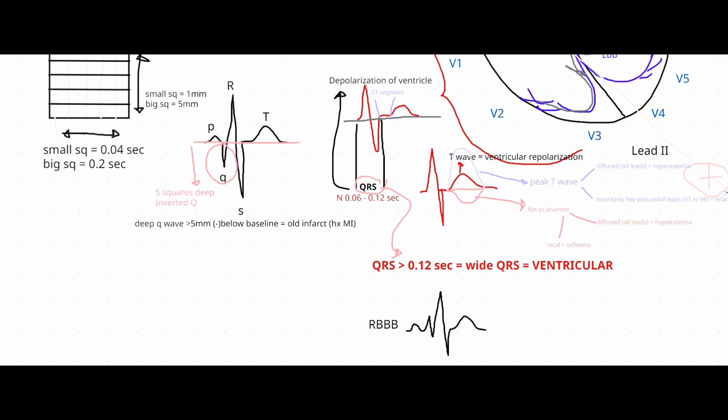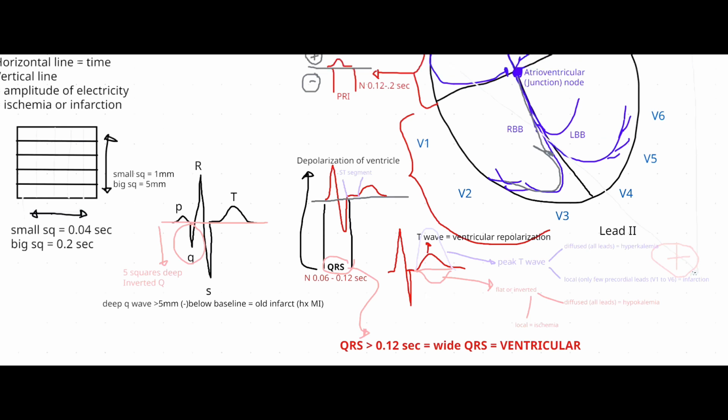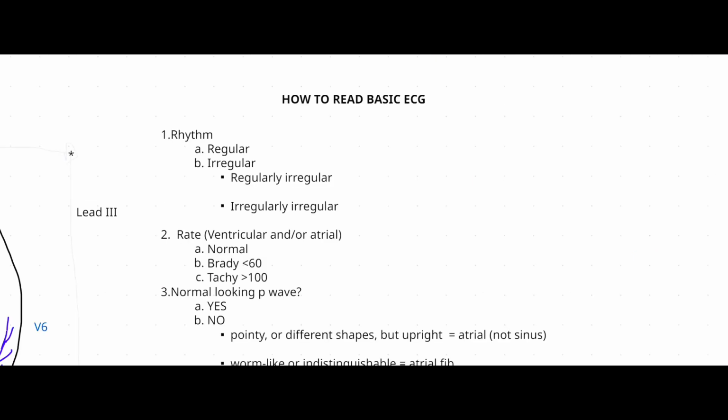When the QRS is prolonged, again, apart from the PVC, then again, it could be an electrolyte issue, hypoxia, hormones, such as in females, the estrogen depleting can cause that. If we were looking at medications, it would be the medication that will cause bradycardia. Let me say basic 3 lead, right? When we're reading 3 lead.